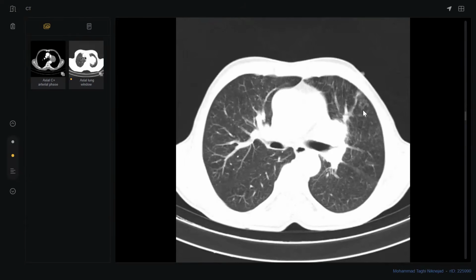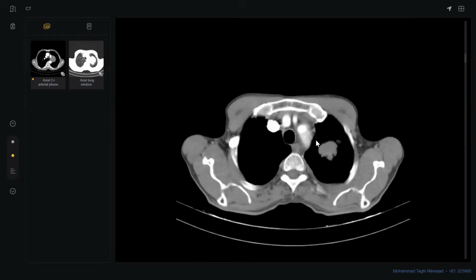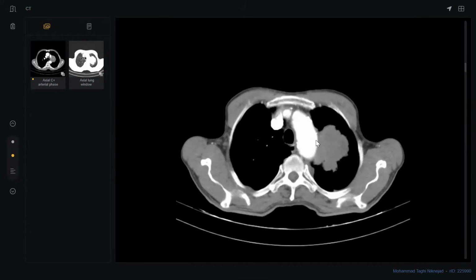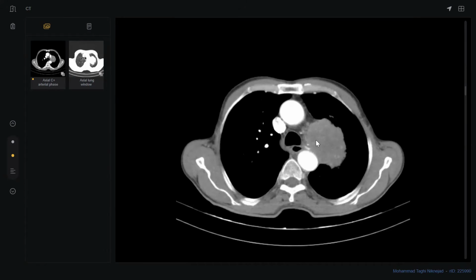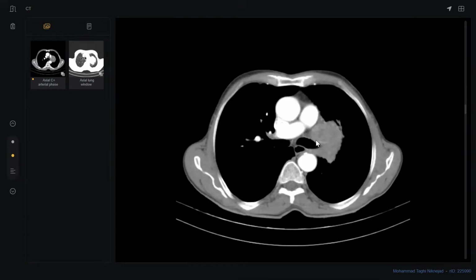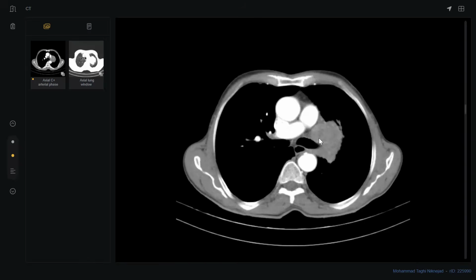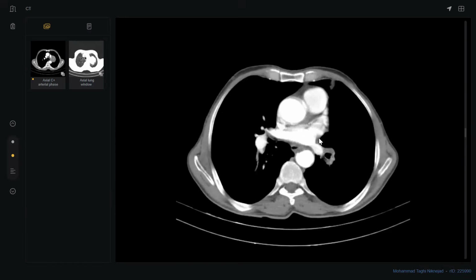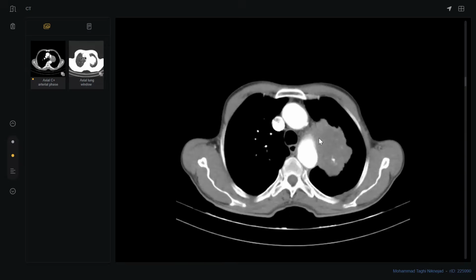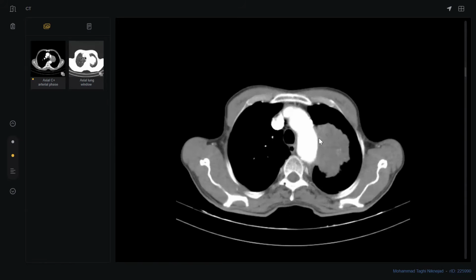You did very well when you talked about this lymphangitis carcinomatosis. Then I give you this one. Okay, describe as much as possible and give whatever differential diagnosis is possible. I think a mass like this, completely encasing and compressing the left pulmonary artery, is a malignant mass. Associated with lymphangitis carcinomatosa, we are on the side of lung cancer more than mediastinal mass.